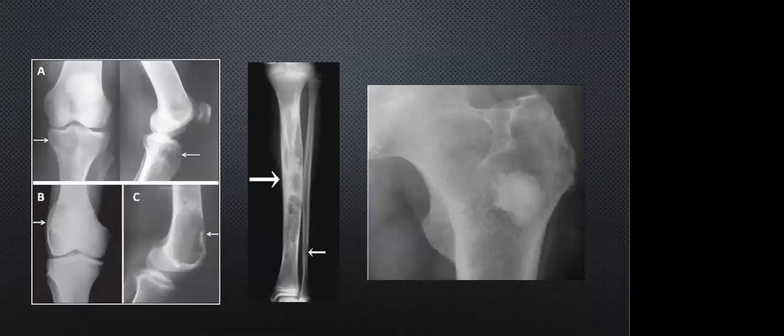So tumors may be lytic, sclerotic, or mixed, and usually have a typical opacity. For example, simple bone cysts and giant cell tumors are lytic. Bone islands are sclerotic, like the picture at the right side, and adamantinomas are often mixed, like the picture in the middle. Sometimes the destructive process will cause a fragment of bone to become sequestered within the lytic region. Such sequestrum may be seen in both benign or malignant processes.